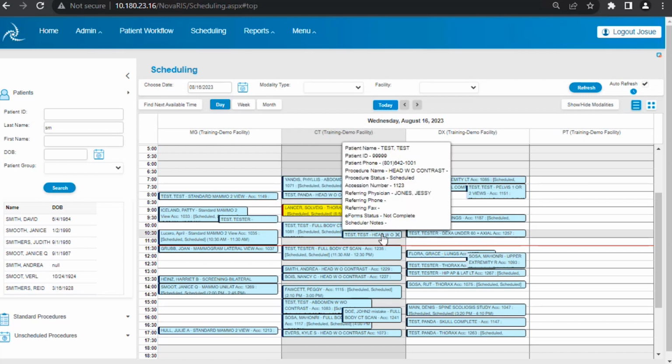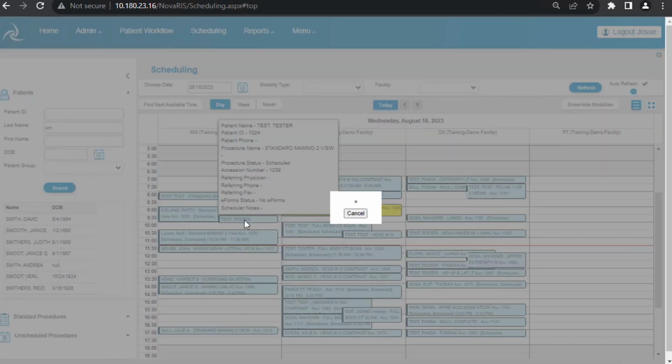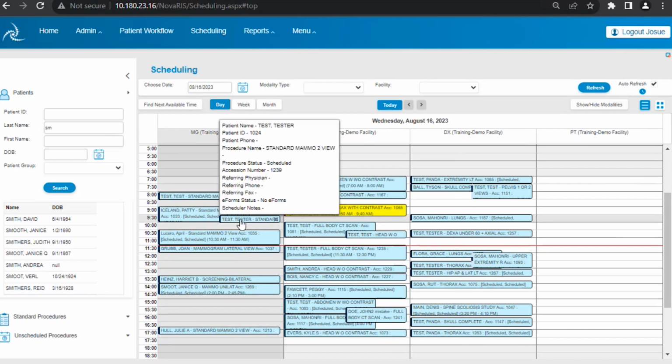However, when you are in a big hospital and you have emergencies, the system will still allow you to do that. So for example, maybe one of these patients, really most of these demos that we added here, are emergencies. So it will still let you do that. If you have a patient that came into your ER that is really an emergency, they will say, you know what, I don't have much time.